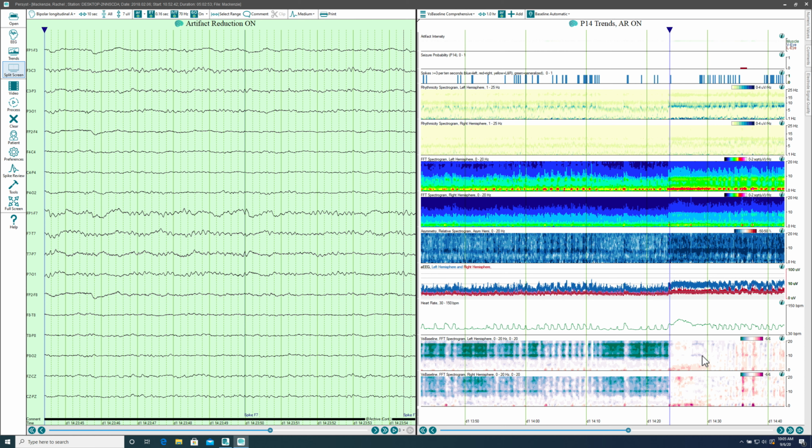The fact that the patient's EEG returns to their initial post-stroke baseline immediately after receiving the dose of mannitol supports the hypothesis that the patient's worsening clinical state was indeed related to increasing intracranial pressure. Indeed, the heart rate oscillating in step with the oscillations in brain function could also be related to the patient's increasing intracranial pressure.